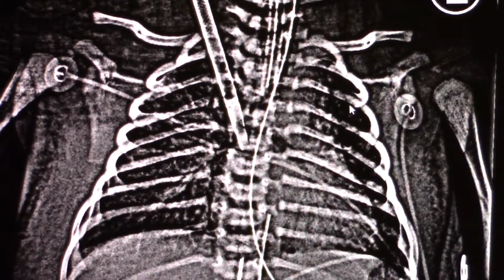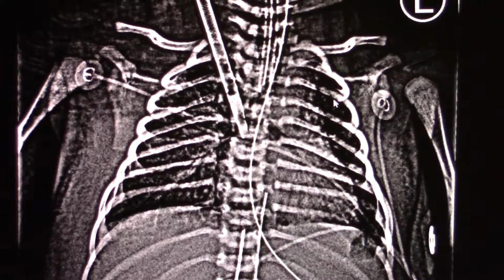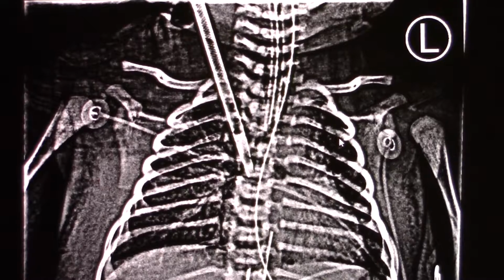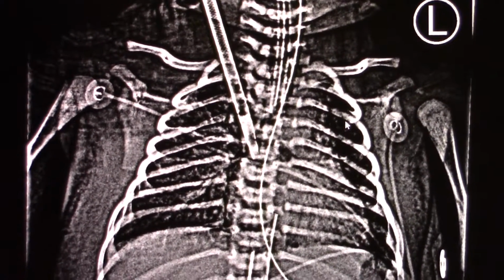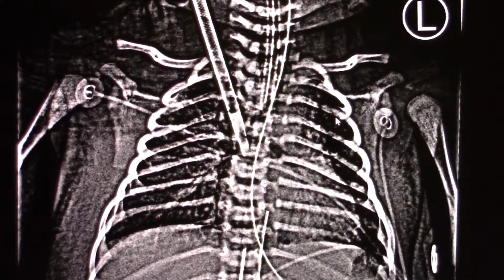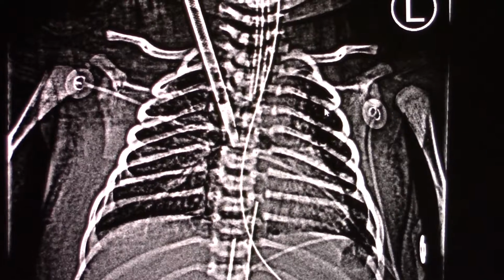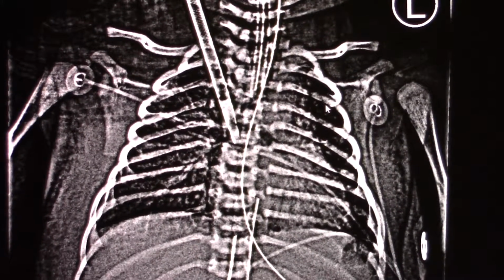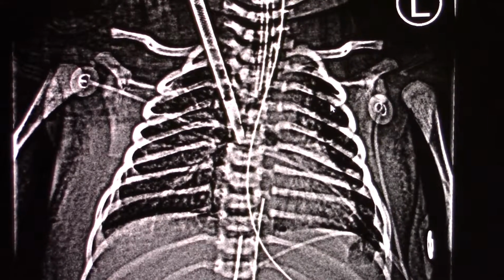And the point of that is when we shoot our x-rays in a midline neutral position, the tube is going to sit in a certain position in the chest. And just because that tube is in that position when the x-ray is shot doesn't mean the tube stays in that position through all movement of the patient. So by shooting every x-ray in the neutral position, we'll get a good feel for where the tube will be at neutral.